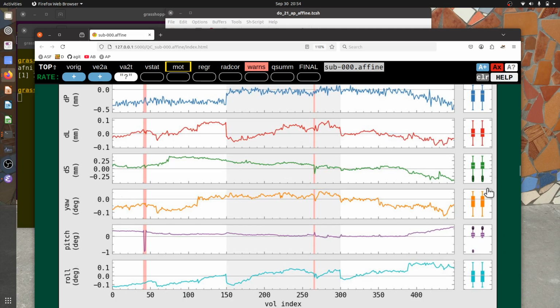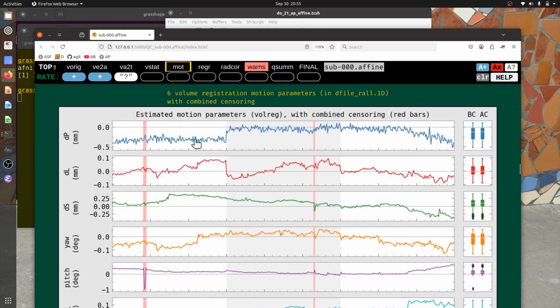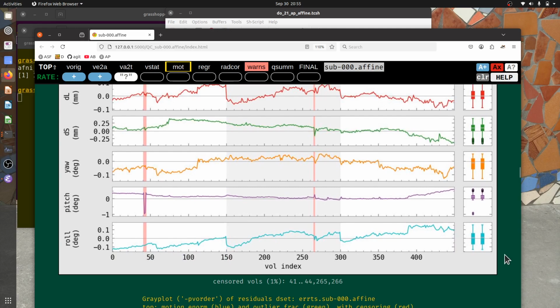And the box plots, again, are here to help guide you. This, again, is not something I look at that often. Sometimes in clinical scans, you'll see odd patterns here, essentially because there may be a pressure cuff or something that very regularly inserts something that appears like motion. Sometimes you'll see kind of a sawtooth pattern. Some of that could be related to apparent motion or other things. So looking at the individual parameters here may be useful for interpreting things. Coil heating, pillow relaxation, subject falling asleep, something like that.